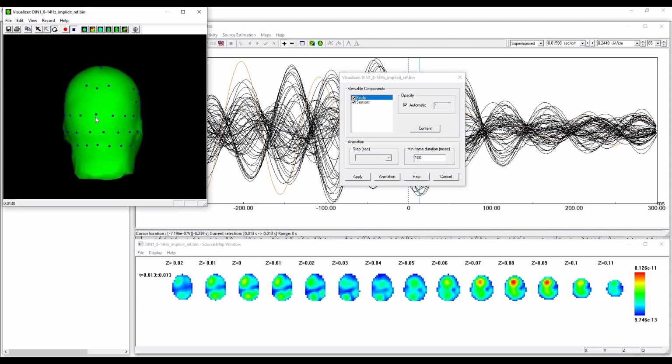Now, because this montage, this electrode array, was set up to emphasize the cerebellum region here, that means that this is going to be disproportionately represented in the average. And when we subtract out the average, we actually can be subtracting out the very thing we're interested in, which is the cerebellar activity. So that's what I think is going on.